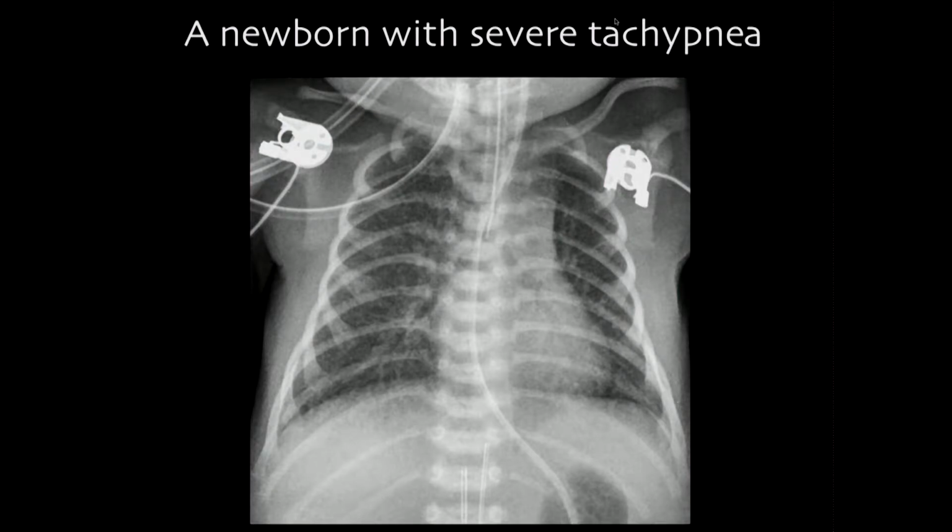So what do you think is the reason the lungs are so reticular? I thought it was increased vascularity. Ah, okay. So that's good, yes. Thank you for describing that. That is a good substrate we can talk about.